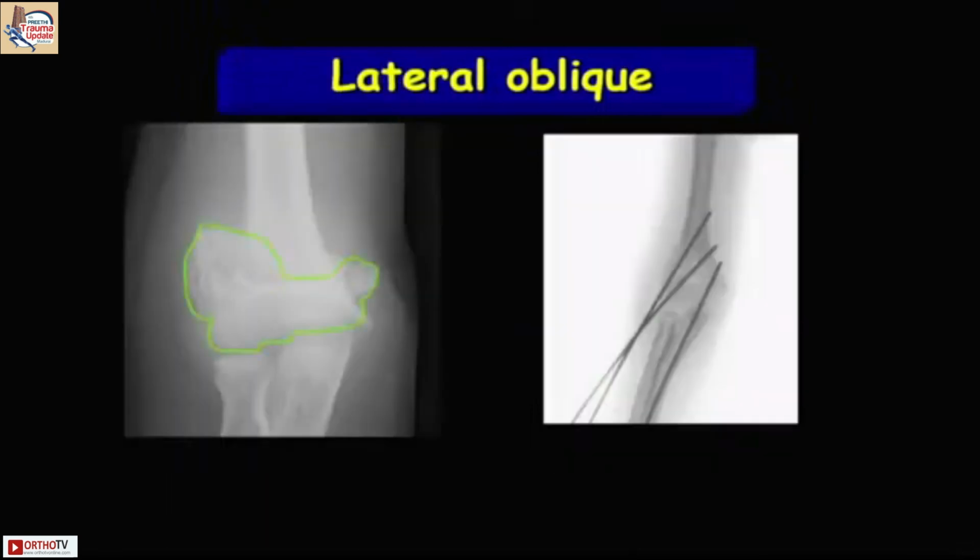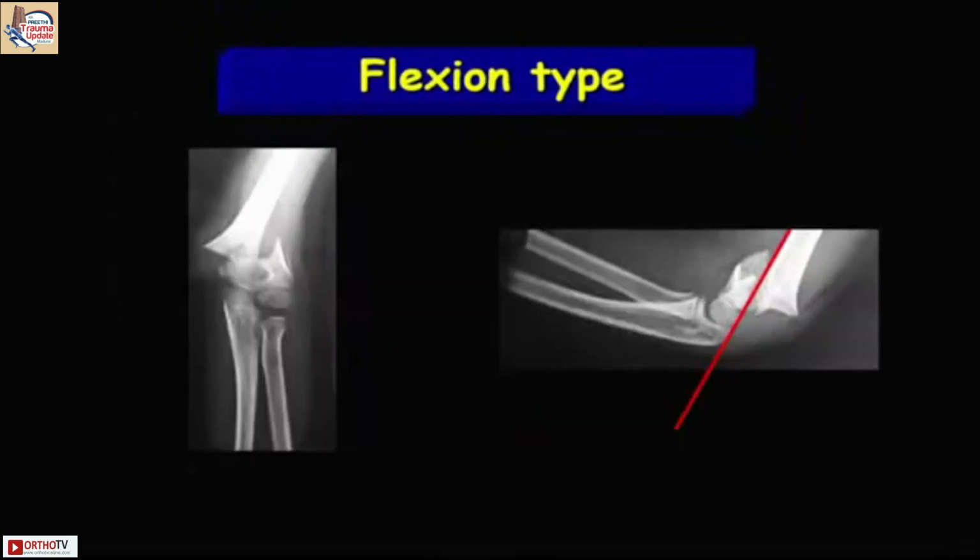Similarly, a lateral oblique fracture, proximally the fracture line will exit laterally. Such cases can be treated by lateral pinning. Now, the anterior humeral line, the capitulum is going anterior to the anterior humeral line. So these are flexion type injuries. Flexion type injuries, especially displaced fractures, may be probably a type 4. So all these flexion type displaced injuries have to be treated by surgical means.